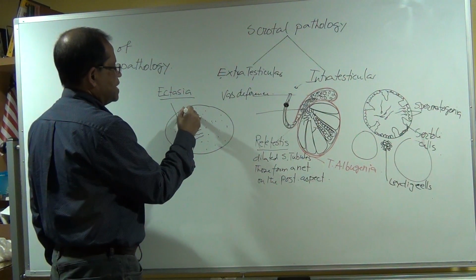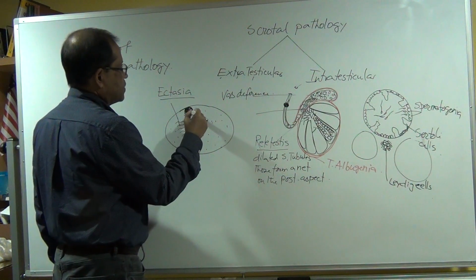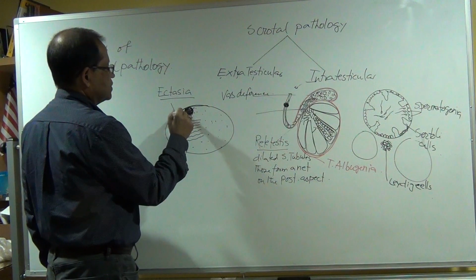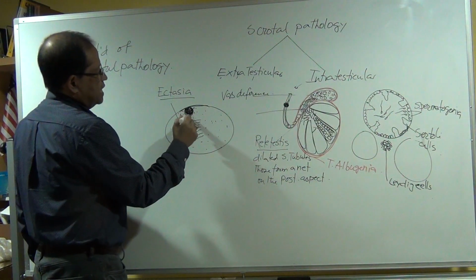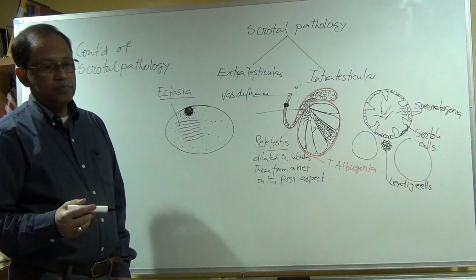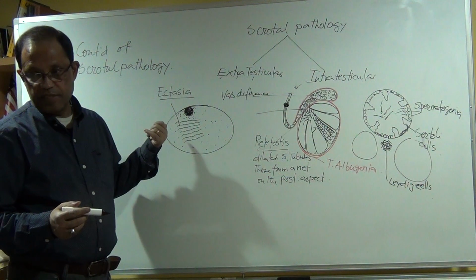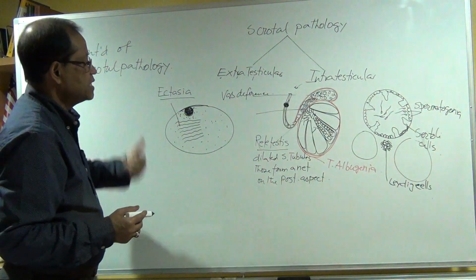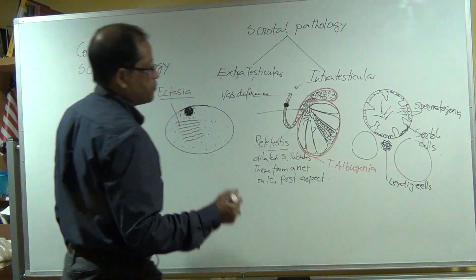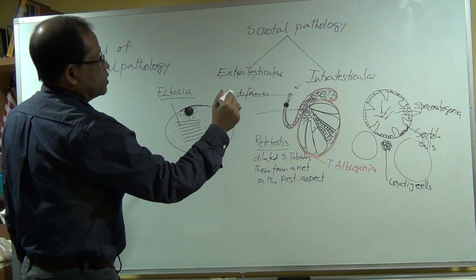A cystic area, they call it subcapsular. And this type of cyst may be one or two. That is due to the result of vasectomy. Okay? Due to the result of vasectomy. Okay, so you understood the internal situation, so it's going to help you.